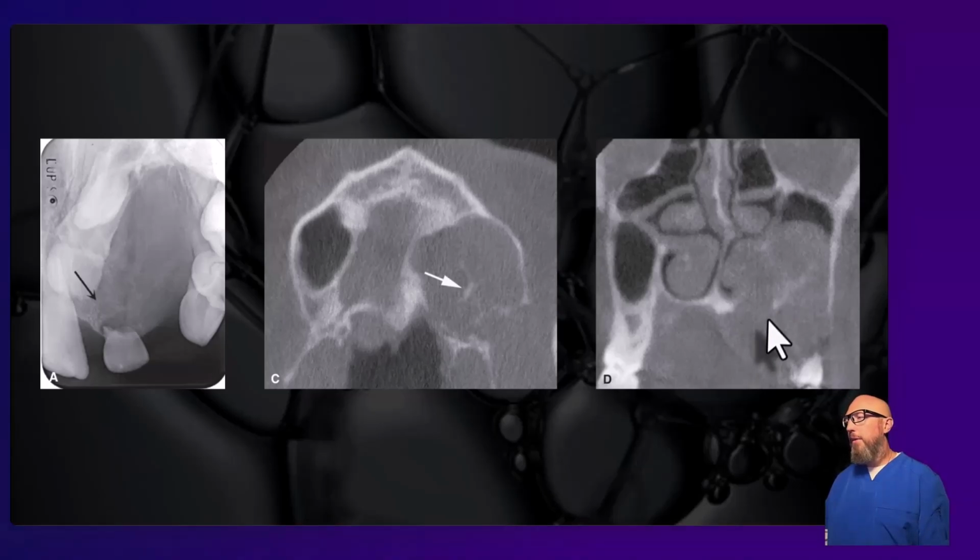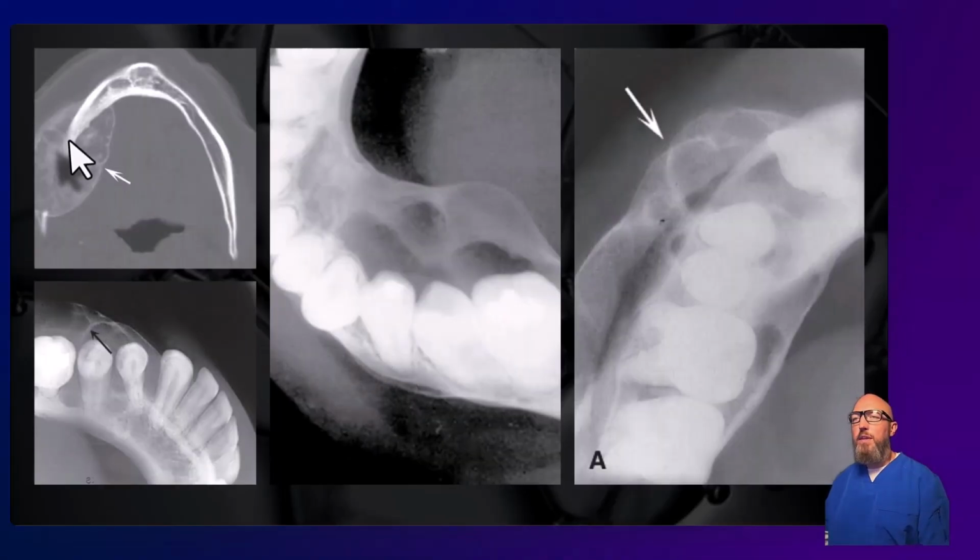The expansion pattern, though, is similar to ameloblastoma, and so a lot about this should lead you toward central giant cell granuloma. Same one with these cases, not those nice, coarse, well-defined soap bubble loculations like with ameloblastoma, although the expansion pattern is similar. Maybe if we knew the age of this patient, it would help. Assume it's a younger age, as we expect with CGCG.